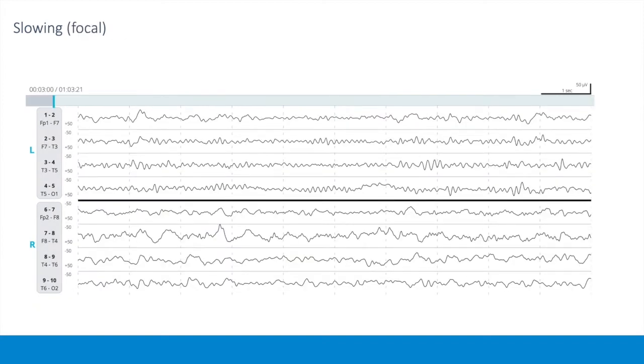Now on this slide, you see that the left hemisphere, the 4 tracings on the top, have a very similar frequency range as the normal one that I showed, but the right hemisphere, the 4 tracings underneath, clearly have slowing. This is the case of a patient who was recorded right after a large vessel stroke affecting the right hemisphere. Again, you are not seeing any epileptiform discharges, you are not seeing major departures from the baseline, and you are not seeing any evolving rhythmic pattern that would be characterized as seizure.